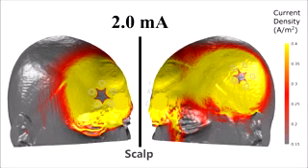At this highly magnified scale, similar to the cortex, the current is widely distributed across the scalp. In fact, the current appears to be continuous between electrodes. This likely represents current that travels through the skin and never enters the brain. As the current is slowly decreased, the current density in the affected tissues also decreases.